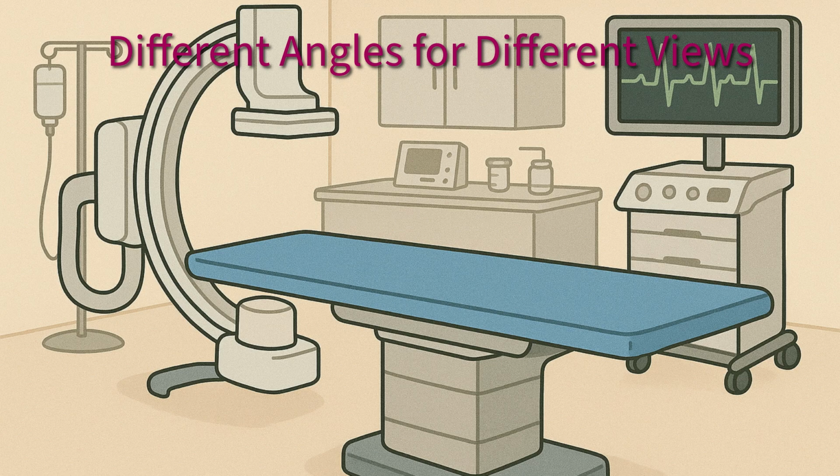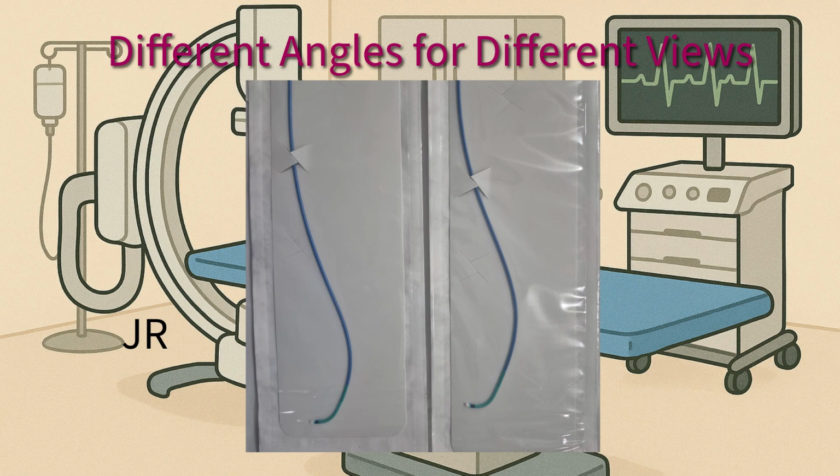Depending on where you need to see, you'll use different catheters for different vessels. For example, you have your JR catheters, or your Judkins right. These are going to be used to see your RCA, your right coronary artery. The angle that's built on them is just specific to engage that right coronary cusp of the aorta so you can get into the right coronary artery and get contrast, or even if it's a launcher, to get your wires down your right coronary artery.